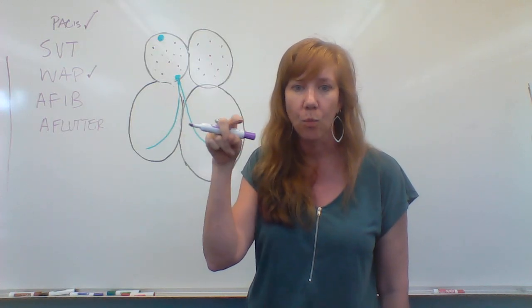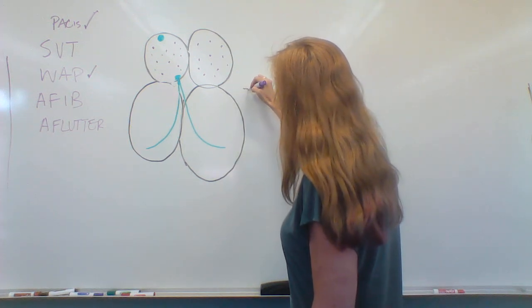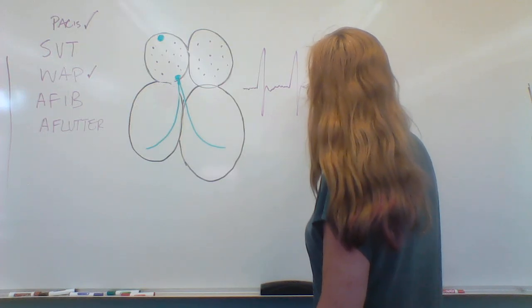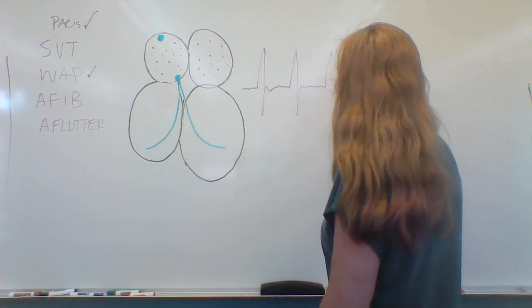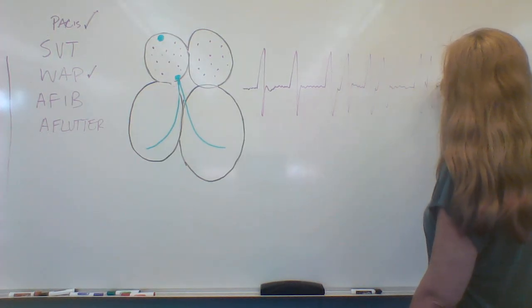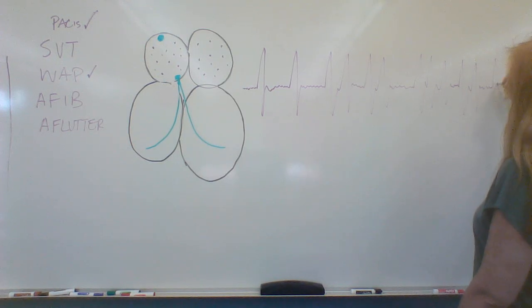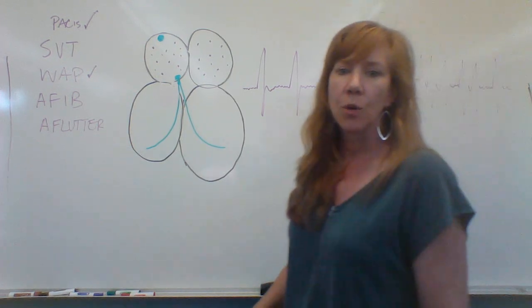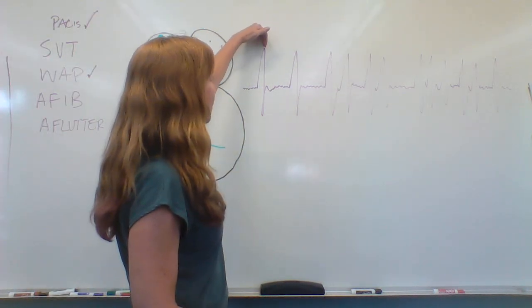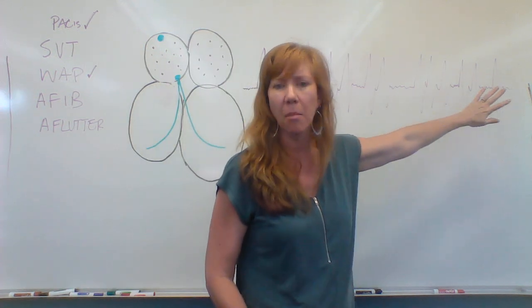The second thing you're going to be able to recognize a strip as being atrial fib is the scribbly baseline. So it's just going to be scribbles, QRS, scribbles, QRS, scribbles, a couple of these in a row, QRS, QRS, scribbles, scribbles, QRS, and the QRSs are all the same. I just can't draw them all the same. So when you first look at the strip, you're going to look at the spacing with your eyes and see that they're really all different distances apart from each other.